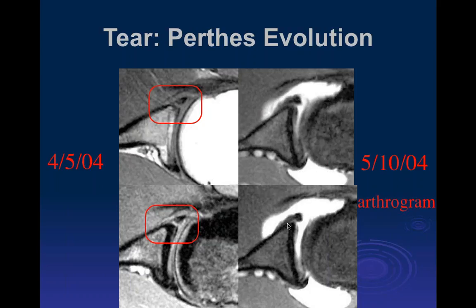And we all have seen thickened tendons and ligaments, and we call them compatible with prior injury. This happens quite rapidly as the body tries to heal it. And notice how much better you can see the details of the tear right after the injury, and how this all gets obscured when you start getting scarring in this particular area. So you can see that the thickening of the soft tissue structures can occur in a matter of weeks, not really months or years.